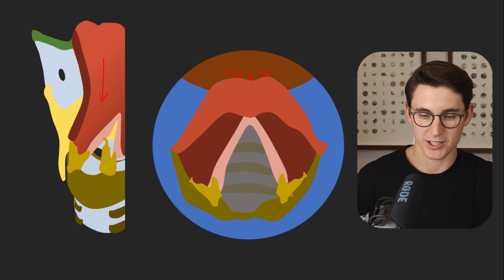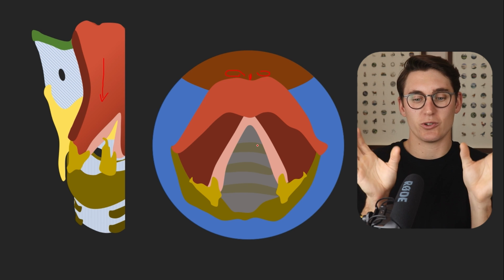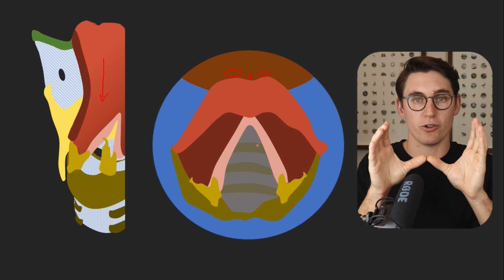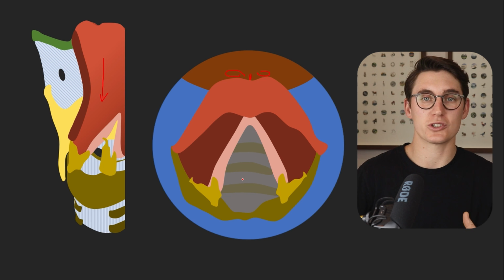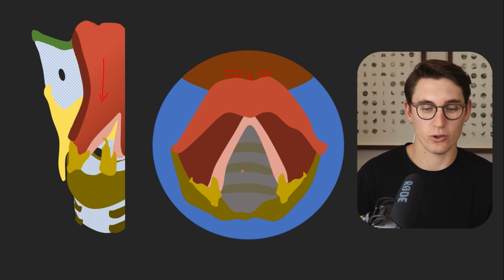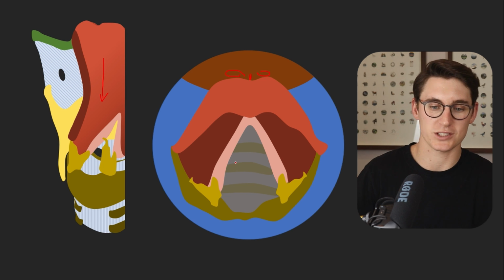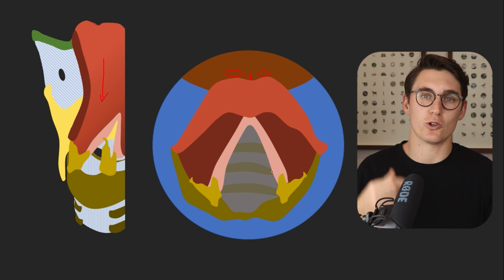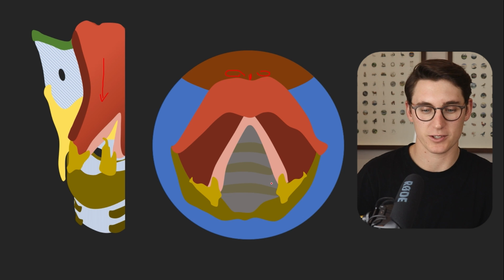We can see posteriorly here our cricoid cartilage with our arytenoid cartilages lying on top of the cricoid cartilage. And we can see our true vocal cords coming towards this anterior commissure here, the angle of the anterior part of our vocal cords. Now, those arytenoids can rotate internally to close the vocal cords or rotate externally to open the vocal cords. Open vocal cords are going to allow us to breathe. Slightly closed vocal cords will allow us to phonate or to speak. The vibration of those vocal cords is going to create sound, and then closing of those vocal cords will prevent fluid from coming into the trachea and actually head down into the esophagus rather.